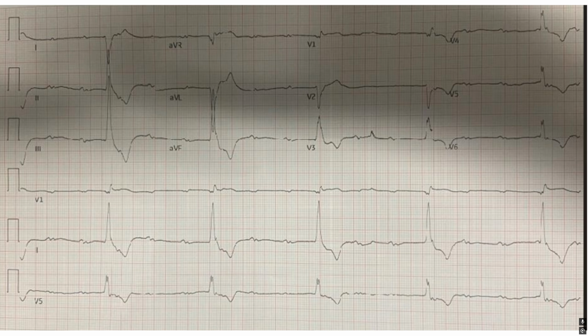All right. As I go through the intervals, the QRS is definitely over 3 boxes. Look at this. It's mostly up in the precordial leads. I know this is kind of confusing, but 2 out of 3 is up, so it's a right bundle branch block. All right. And for the QTC, does not look prolonged to me.